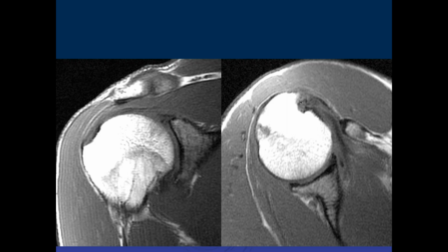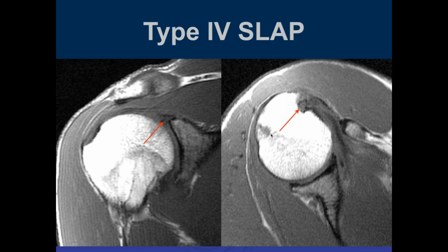If we get the axial images, we can see the biceps is very degenerative. Yeah, it's very small, with signal more distally. So that's the biceps there. And this turned out to be a superior labral tear, and then really a degenerative tear extending all the way down the biceps here. And they ended up treating this with, as John said before, they just resected the biceps and did a tenodesis because these can be very painful.